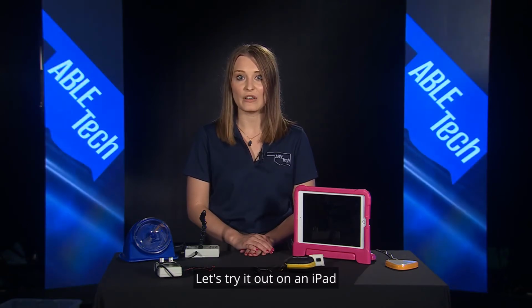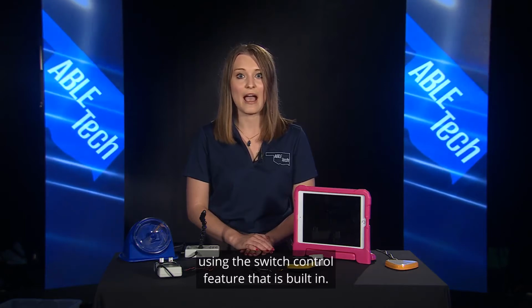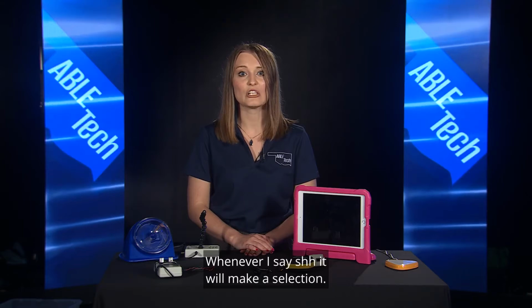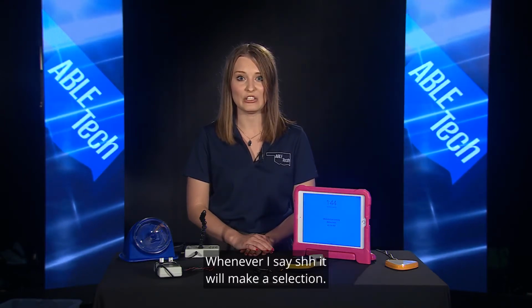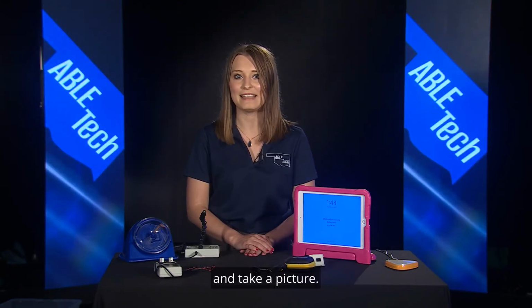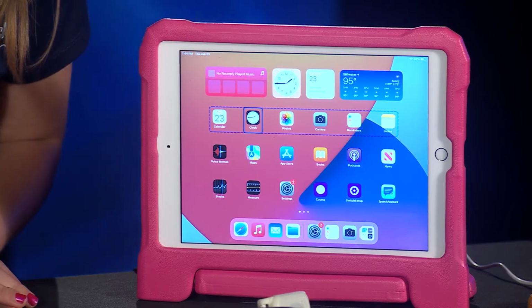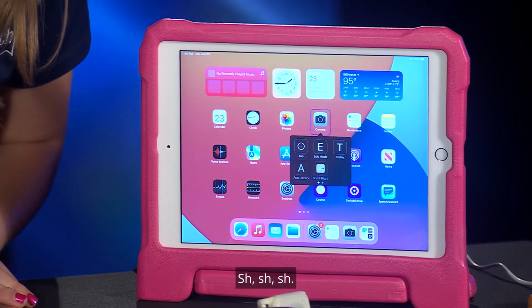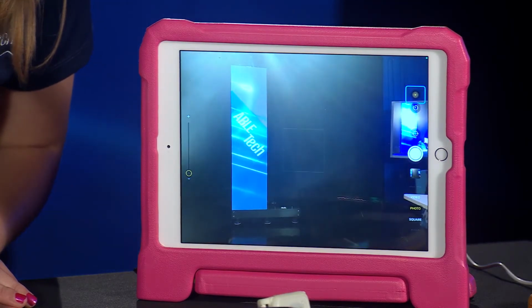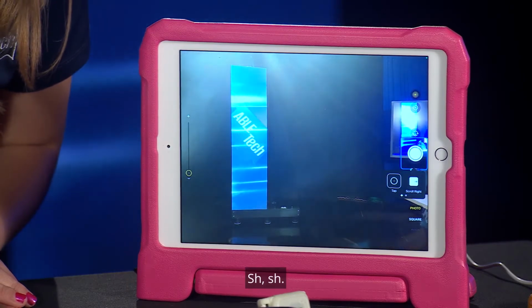Let's try it out on an iPad using the switch control feature that is built in. I'm going to select shh as my sound. Whenever I say shh, it will make a selection. I'm going to use it to open up the camera app on the iPad and take a picture. Shh. Shh. Shh.